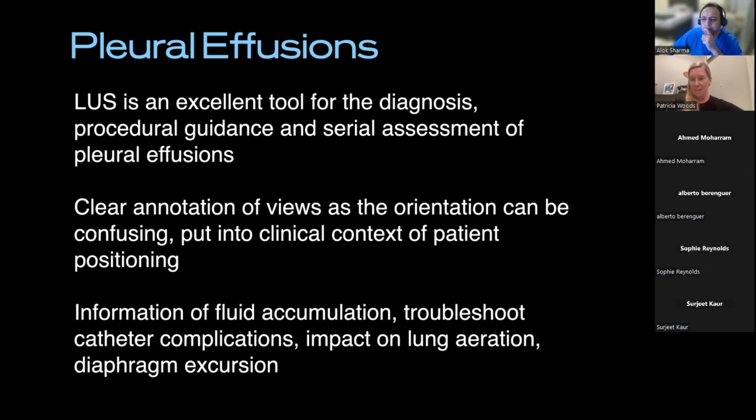You're interested in dependency. Fluid's easy, isn't it? It's going to move around and slosh around a bit. We often find in the left anterior side around the aortic arch, you might find almost pockets of fluid that tend to stay there. They're quite prominent, wedge-shaped, and I'm just like, yeah, that's interesting. Sometimes even on the right side more within the middle lobe. So there's going to be areas where the fluid is going to move around less, and that's just anatomy and where it slides in between different lung lobes. But for most simple principles, you're going to find the area of dependency giving you the best weight.